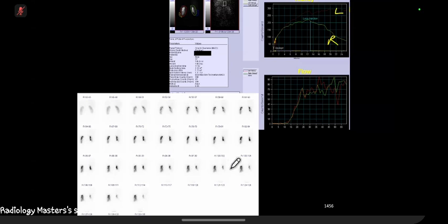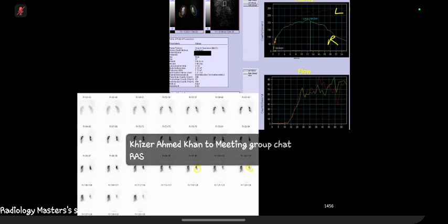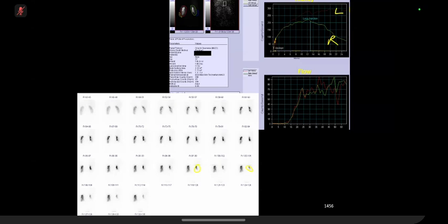Whereas on the left-hand side, there's accumulation of tracer, and this corresponds to what you can see with the red part of the graph, where in spite of the Lasix injection, the accumulation just carries on. And this is obstruction, okay?